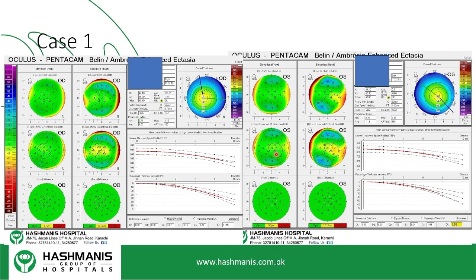So the images that we saw earlier, where you got the normal best fit sphere and then you exclude the first 3.5 and extrapolate from the sides, and then when you go right into the center, there was no exaggeration such that this would cause any sort of problem.